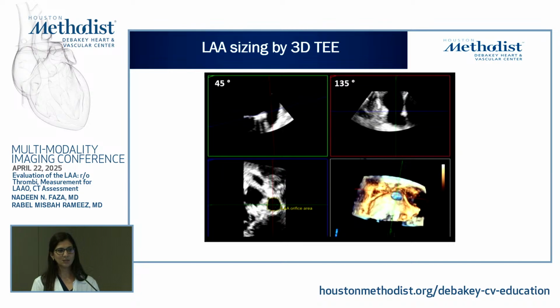And 3D imaging can be very helpful also to get this en-face view of the landing zone, and you can get your minor and major dimensions using 3D imaging.